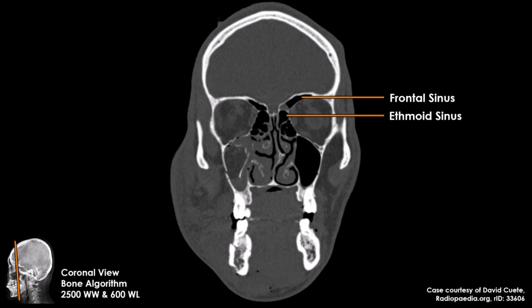This image again gives us a very good view of the maxillary sinus. The left maxillary sinus is clear and filled with air. The other sinus is filled with blood and fat from a facial injury. The lower half of the bony nasal septum is formed by the vomer. Notice that this patient has a very crooked nasal septum.